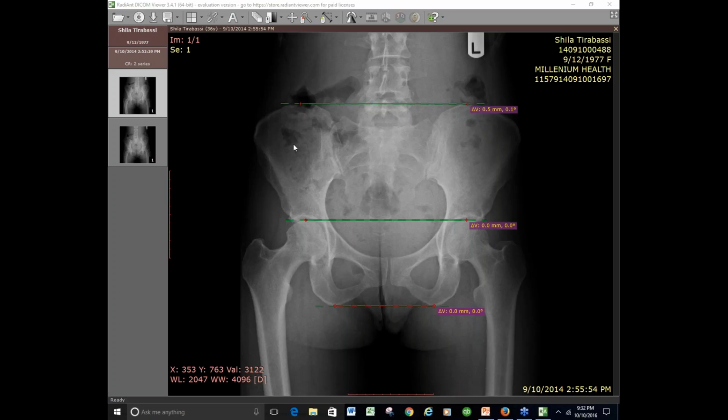Depending on where the fusion is, that's where your call as a therapist starts to come in. Where was it fused? How was it fused? There are physicians that take the extra time and will basically get rid of a scoliosis and fuse a spine straight. And then there are some that just fuse it in the position it's in right now, right? So you have to see where the fusion is, because if they did it straight, you can straighten them right up. The rest of the spine can move and they're fine.